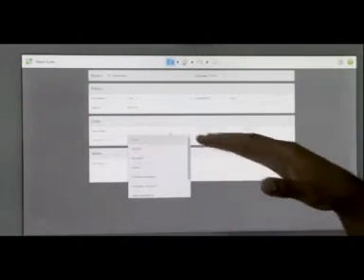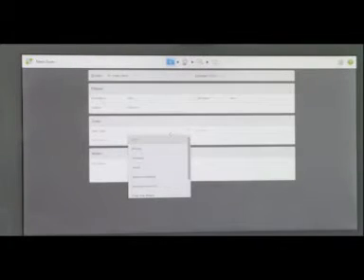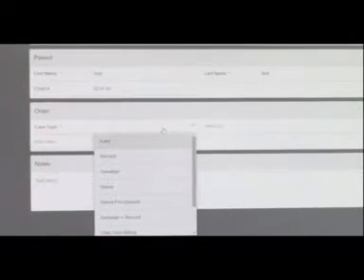Okay, so then we go to case type. iCast is your study model. The last model that you would probably put a 3D base on and ask your lab to print. Now it's digital. So if you finish a patient and you scan, it will be loaded with a 3D base, and whenever you want to print it, you could then ask your lab to print it.